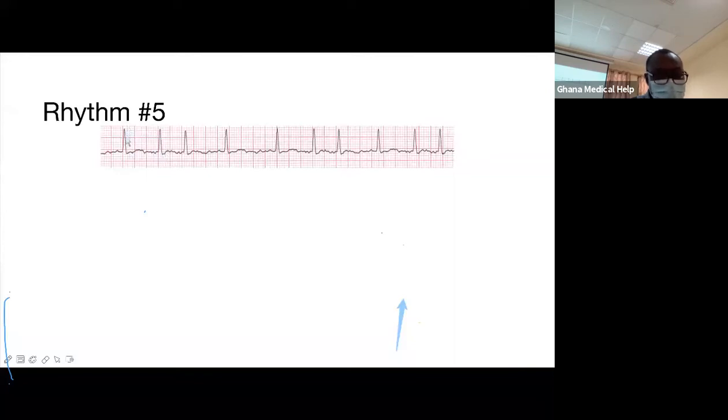So if you put a caliper from here to there, or use a paper to trace from here to there, this distance between here and there should be the same as this distance, and that should be the same as this distance. Obviously, even the blind can see this is bigger than this one. Is that not so? So it is not regular.